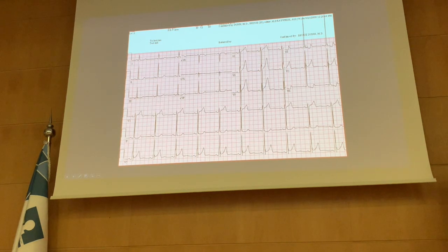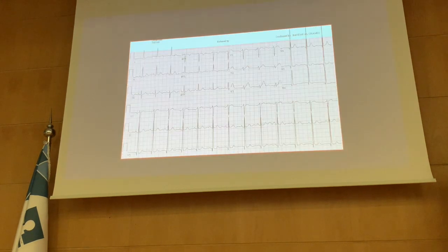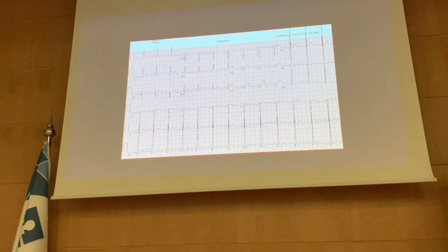Okay, so this patient for sure has left ventricular hypertrophy. But you're going to examine deeper. Does he have any atrial abnormality also? He may have left atrial enlargement. Okay, this example is from Dr. Bandaravandi's clinic. Who's going to answer this?